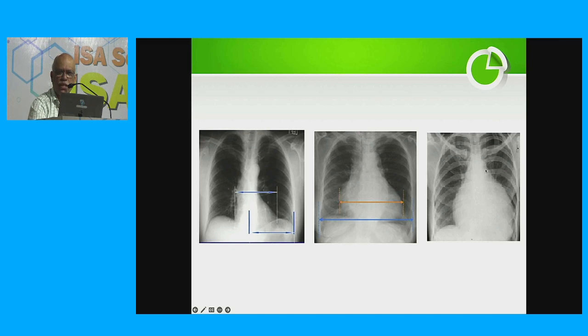It is somewhat like a balloon filled with water. So it looks more like a pericardial effusion. So it is a ballooned out heart. Most likely pericardial effusion. So this is the importance of cardiac shadows, cardiothoracic ratios, cardiac borders, and all.